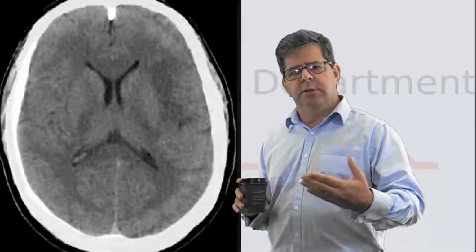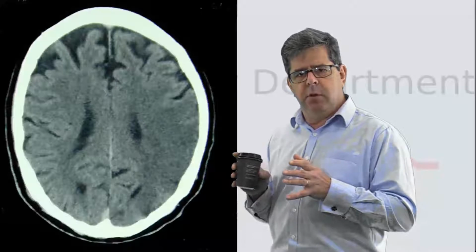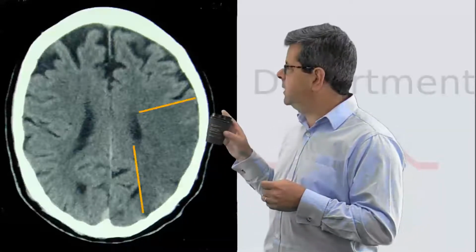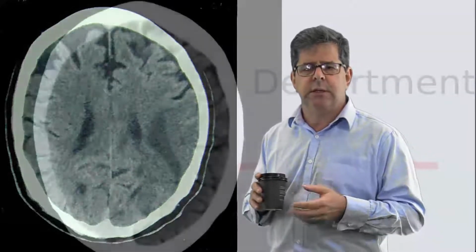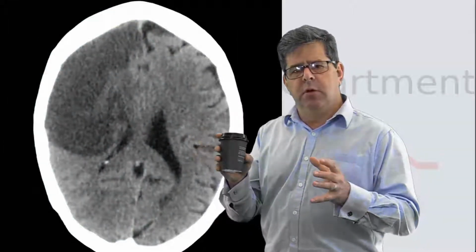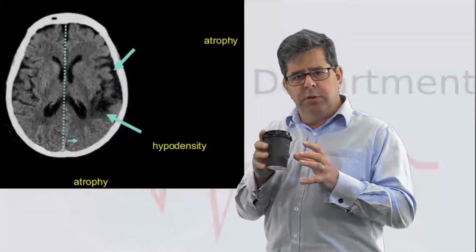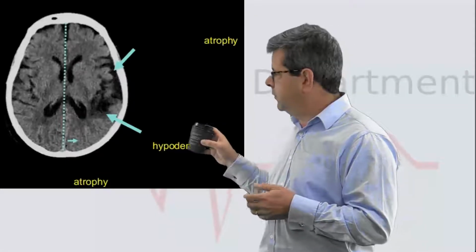Over the next couple of hours, the patient will develop edema in that area, which is why it gets darker on a CT and why it starts to swell. And you can see it more demarcated in the next few hours. Now, this edema, which we can see here starting out, gets worse and worse. In fact, it maximizes at about 3 to 7 days. As it goes past that maximum, it then starts to resolve and the body starts to resorb some of that cerebral tissue, and you head to an area where you actually involute that area and the CSF comes in and fills that gap, an old CVA like this.